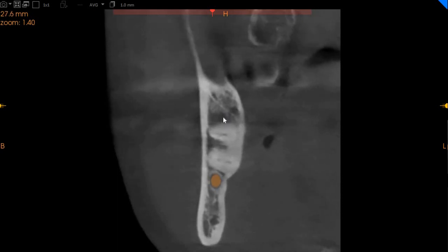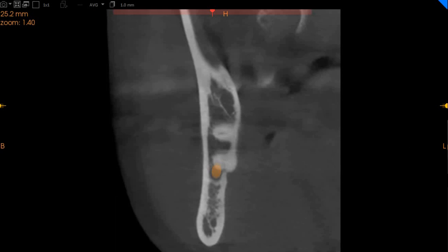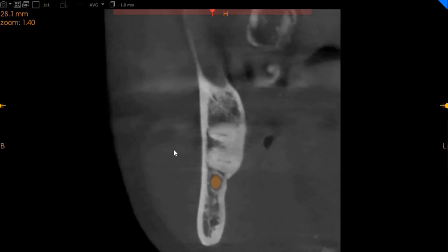There is a horizontal impaction of the lower right 8. Fused roots for the most part at the apex. It separates as the mesial and distal. The mesial root is in very intimate close contact with the inferior alveolar nerve, while the remainder of the lower 1/3 of the root apex is definitely in contact with the inferior alveolar nerve, and it's also fused to the lingual cortical plate. So this tooth should be extracted with extreme caution.